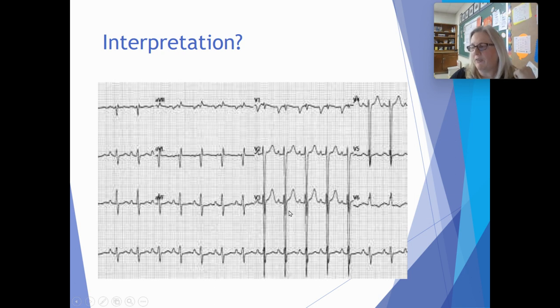Okay, we do see definitely some big QRSs, which typically mean LVH, right? Whether this is good LVH or bad LVH, we don't know because we don't know the age of this patient. We can probably guess the age though. I'm guessing this is a female, but not young, probably 40s or 50s, because we have one inverted T wave in V1 that's just normal for them, but they have chronic high blood pressure probably because they have really big QRSs.